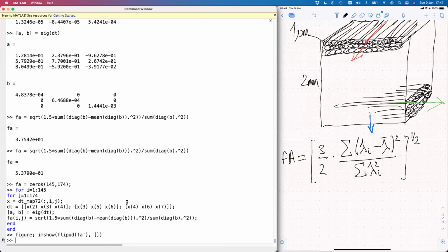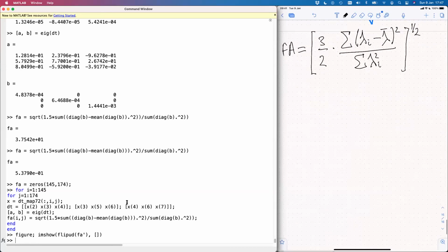So I just want to do one last thing before we end, which is to do a slightly more complex estimation of the diffusion tensor using weighted linear least squares rather than the standard linear least squares, which we've used up to now. Why would we want to use weighted linear least squares? Well, let me try to motivate that to start with. So, of course, using standard least squares makes the assumption that we've got identically distributed Gaussian noise on all of our individual measurements.